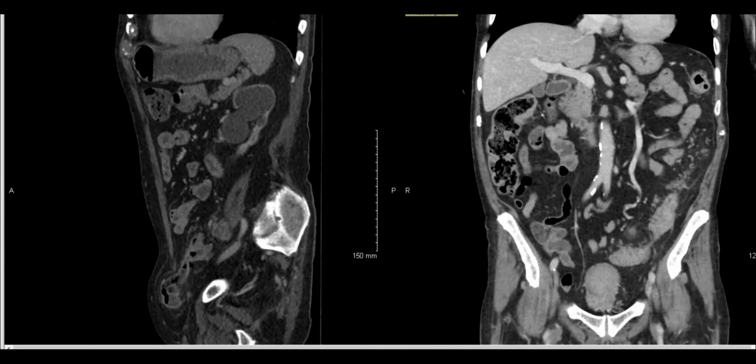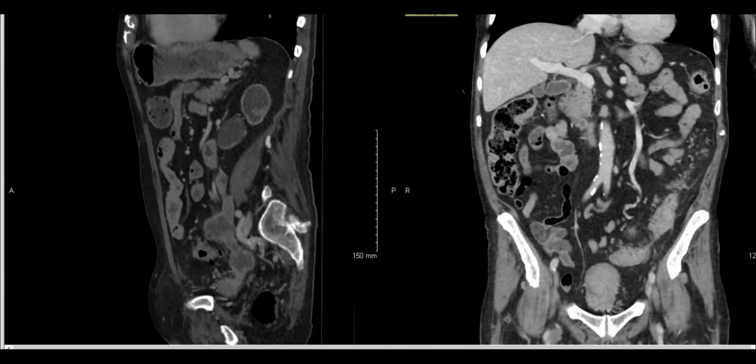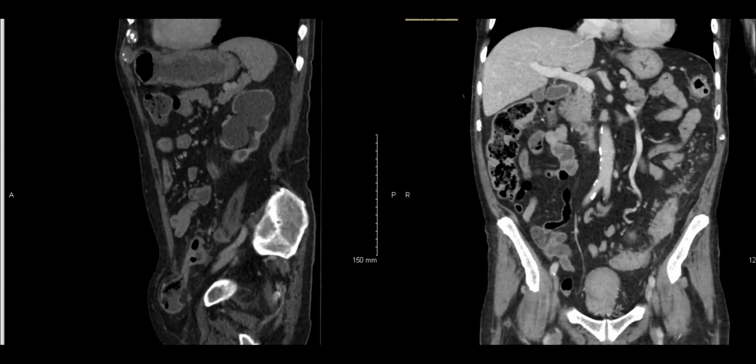I agree, Steve. It's like it's on its way to forming a giant diverticulum, which in and of itself is a pretty cool finding. But this is a peridiverticular abscess just kind of drooping down into the shape and extending into the hernia. Anyway, I thought it was a pretty cool finding.